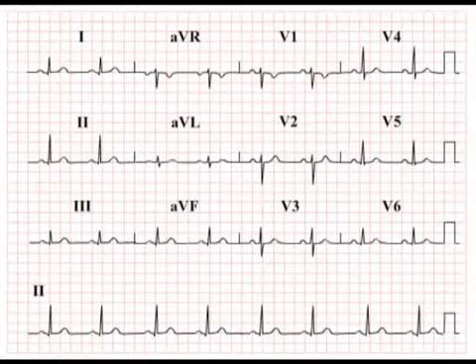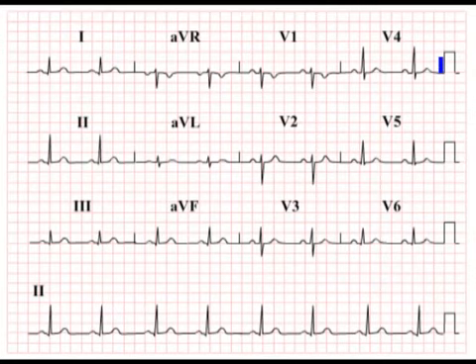However, on this particular ECG, a standard calibration box of 2 squares vertically and 1 square horizontally indicates that the ECG machine is correctly calibrated at a running speed of 25 millimeters per second and a sensitivity of 10 millimeter deflection for every 1 millivolt of current.